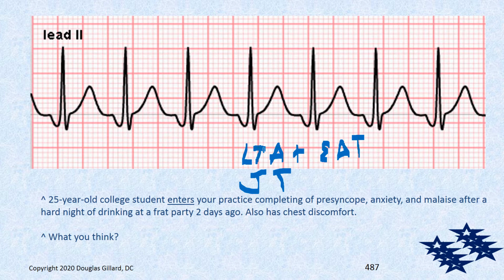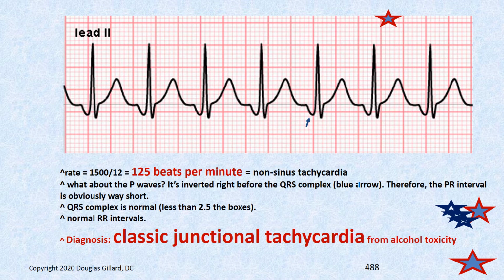So now what's the difference? Well, with EAT, with atrial tachycardia, they have usually a normal PR segment and PR interval. And there is no PR segment here. So that's right. It's a junctional tachycardia. In fact, what part of the junctional region is it coming from? The proximal portion, or maybe the accessory tracts. All right, so that's the exact deal with that.